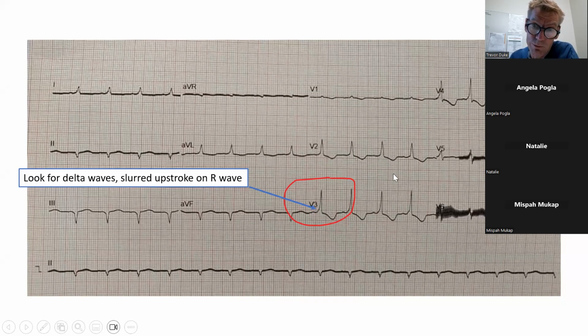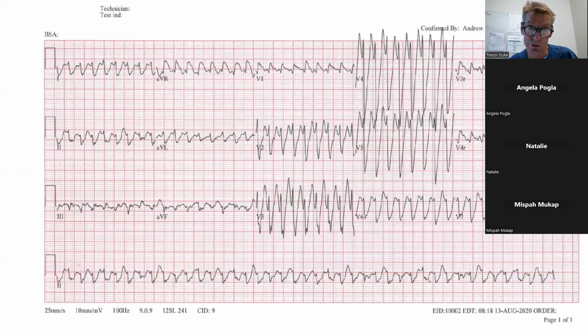This is a little bit more advanced, but today I'd just like you to know the characteristic features of supraventricular tachycardia and ventricular tachycardia. Remember, in supraventricular tachycardia, you can't see P waves, and the QRS complex is narrow, like normal. And in ventricular tachycardia, the QRS complex is wide, because there's a pacemaker that's starting somewhere besides the AV node and going a slow way around the ventricles.